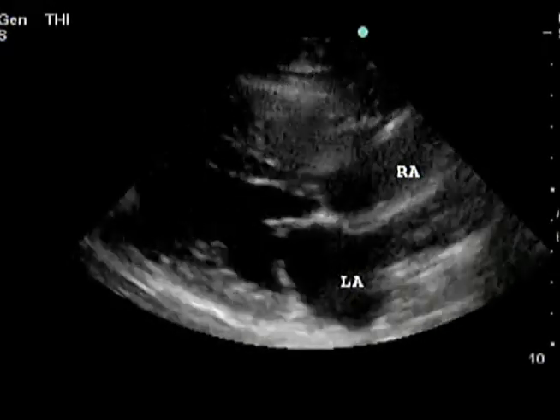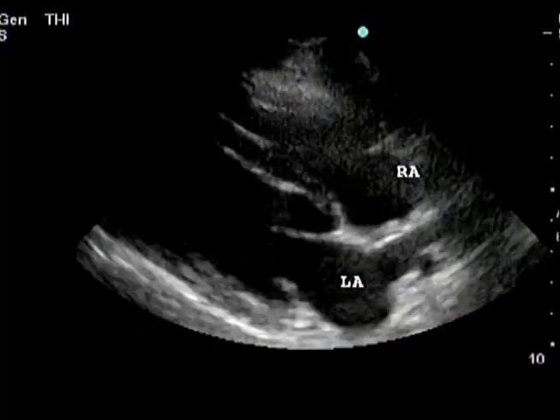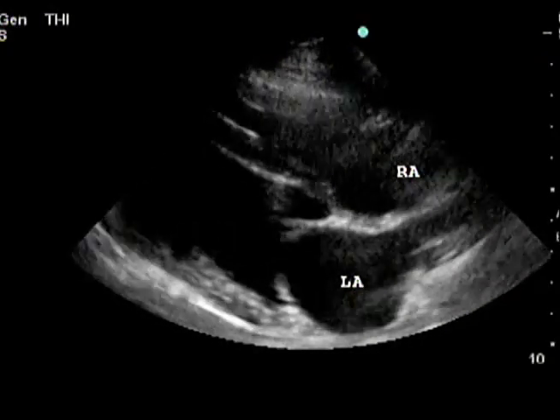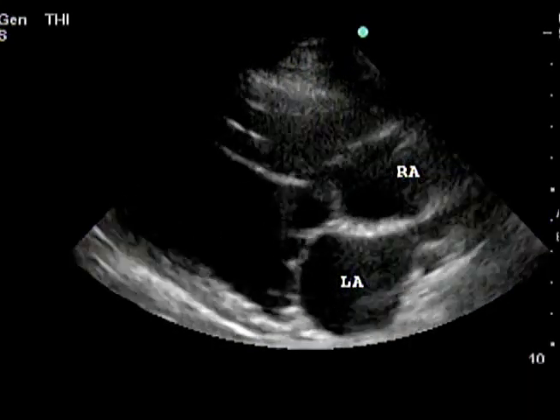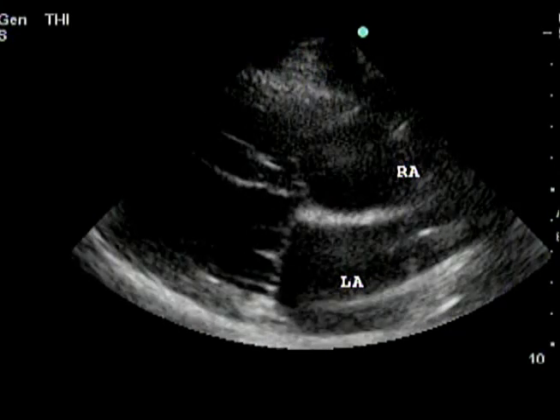Note the right main pulmonary artery, RMPA, as it crosses over the dorsal left atrium on its way to the right lung lobes in this right side long axis four-chamber view. In mitral regurgitation, these pulmonary arteries are anatomical structures you need to recognize. Notice how the right main pulmonary artery increases in size as it fills with blood during ventricular systole.